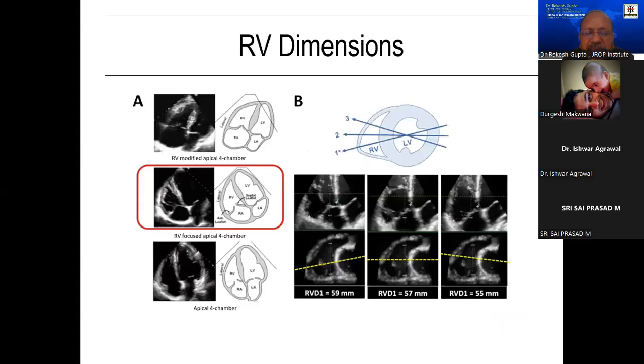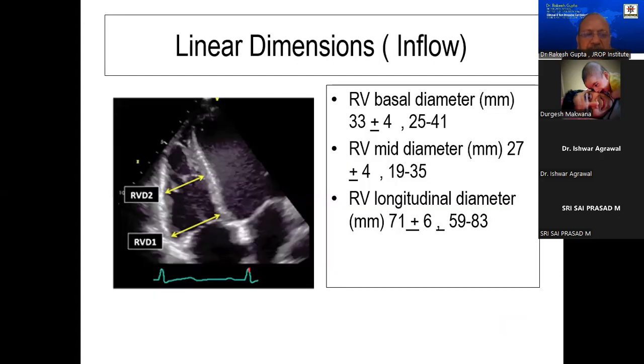Last, RV dimensions, as we have told before, like chamber quantification. I'm not going to show you these dimensions again.